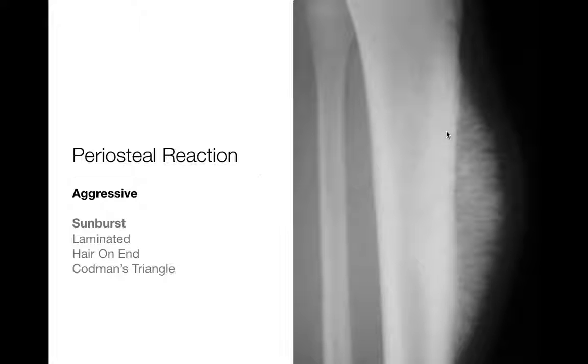We don't really see a tumor here very well. You get the vague idea there's some sclerosis here. This was a periosteal osteosarcoma in this case that was causing this periosteal reaction.